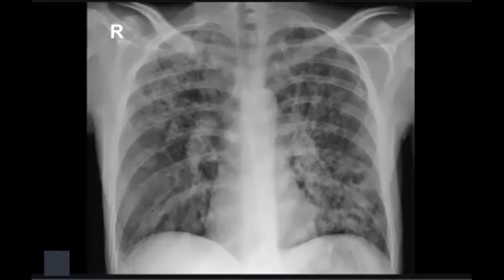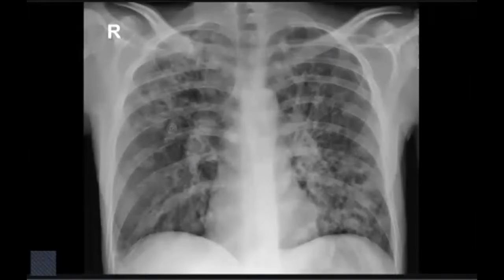Chronic cough, 30 years old. Frontal radiograph, skeletally mature patient, for the chest. The patient comes with a chronic cough and he is 30 years old. I can appreciate evidence of bilateral reticulations scattered through both lung parenchyma.